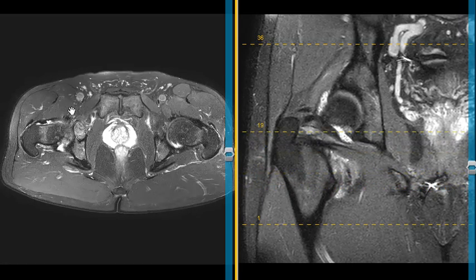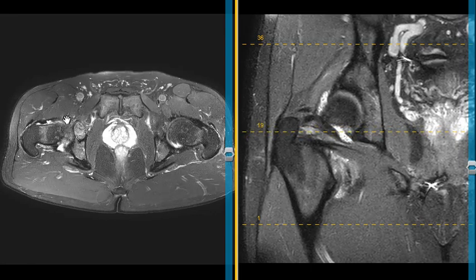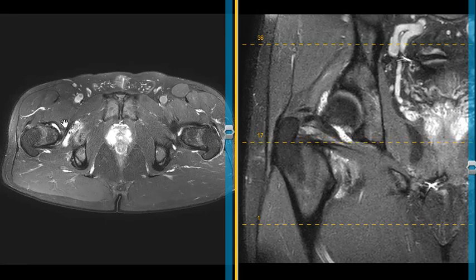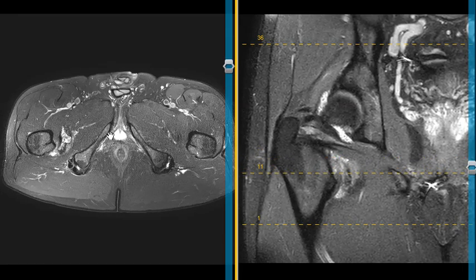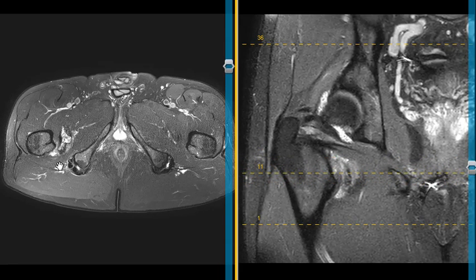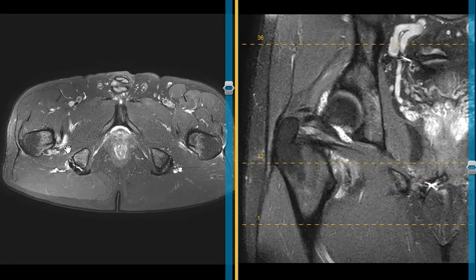And over here we have the iliopsoas muscle complex, and here's a central tendon. The iliopsoas comes down, and that little dark band there will come down, down, down, down. There it is right there. And it's going to attach on the lesser trochanter. You can see the attachment right there. And all this inflammation is along the medial margin, so this is that potential space of the bursa.